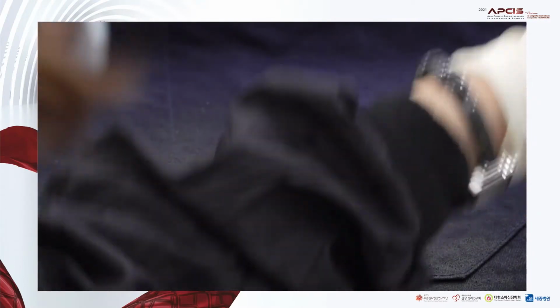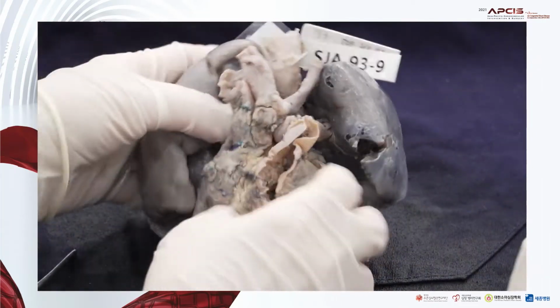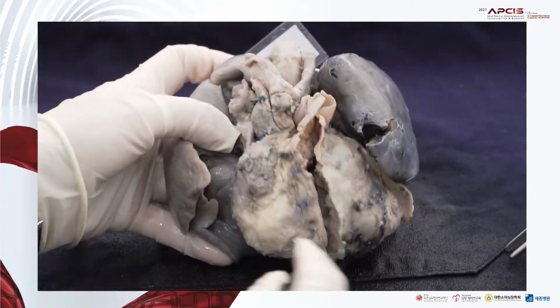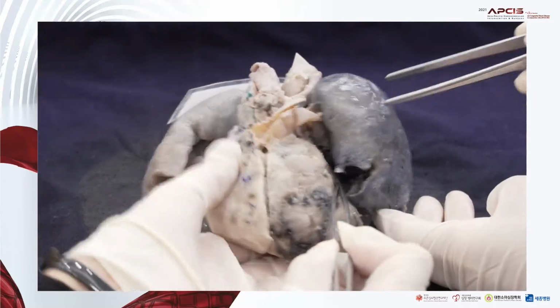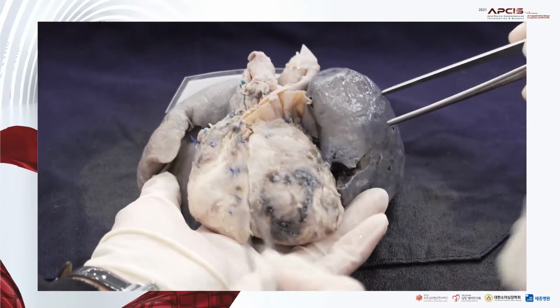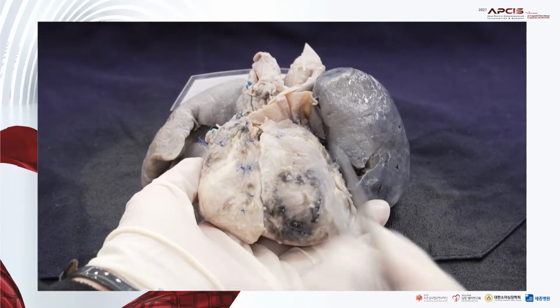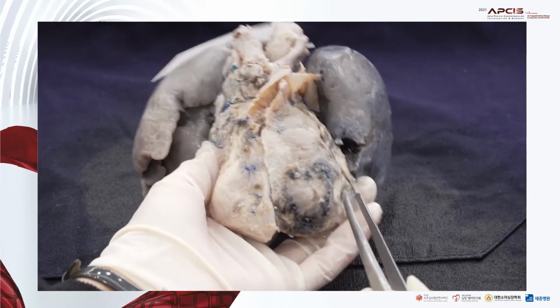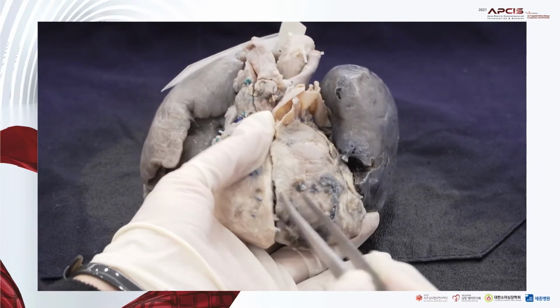Then let's move to the cases after operation, after correction. Here you can recognize the potato shape, or bulbous shaped ventricle part of the heart, indicating right ventricular hypertrophy.